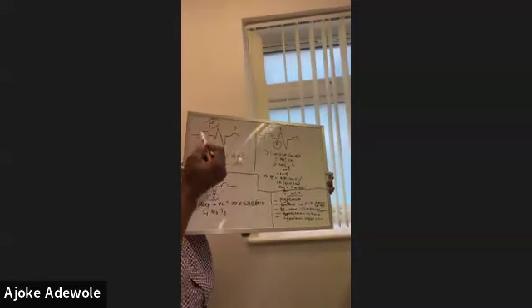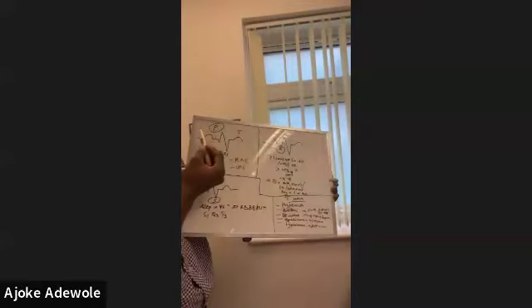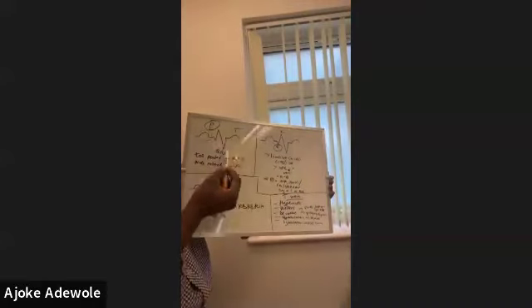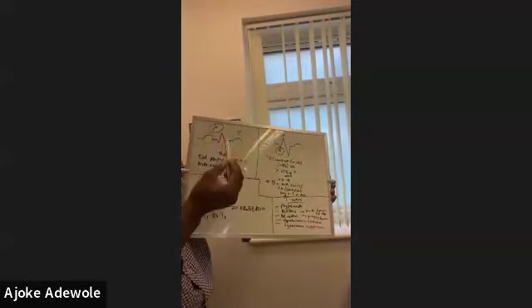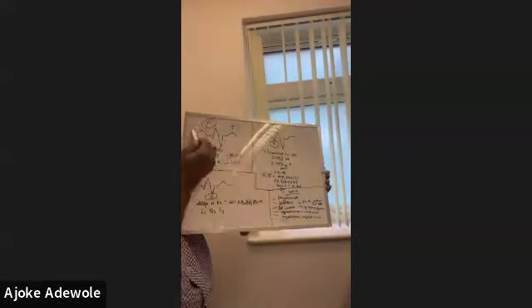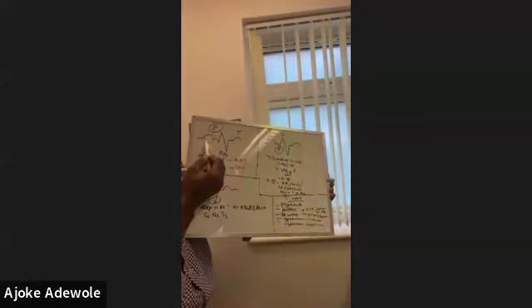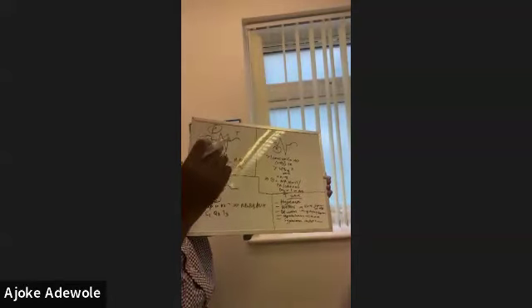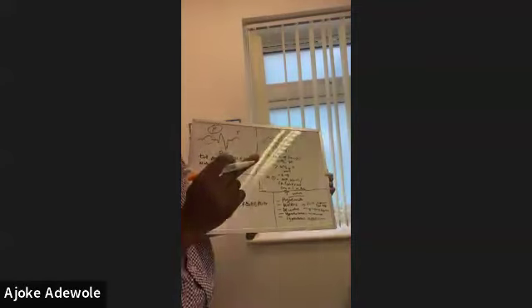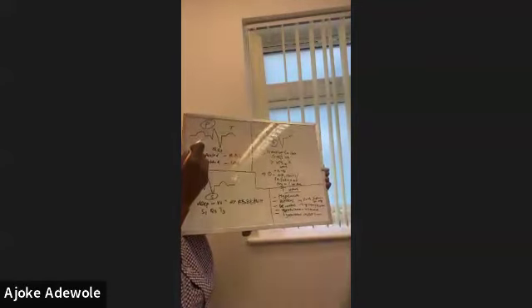So if you see an ECG, each complete transmission of electricity is what you have as the PQRST, and this is what you have as a single beat. So this is the P wave, and this P wave, like I said, is when the electricity passes from the pacemaker, which is the sinoatrial node, through the atrium. It's trying to get to the ventricles and other parts of the heart, but it goes through the atrium first.